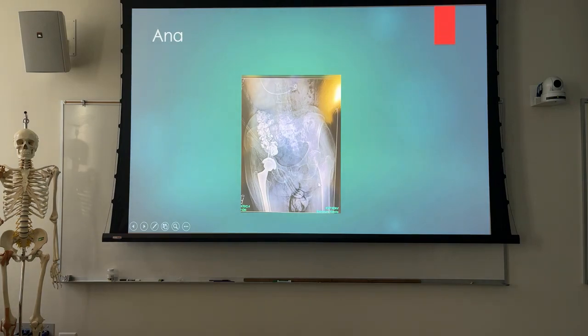You know, what were we looking for on this one though? Where are you? There you go. Oh, I didn't take that. You didn't take it. No. Okay. Well, it looks like it's probably post CT. You know, obviously a little better centered. Almost looks like a pelvis with the image receptor misoriented. But you know, we might have been looking for whatever this thing is.